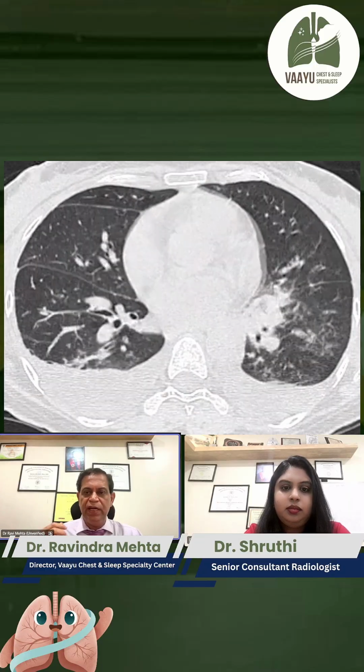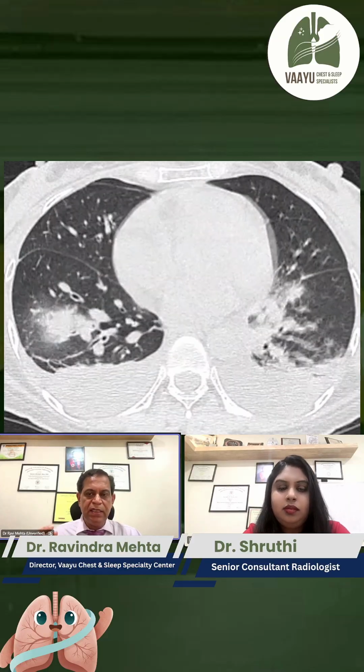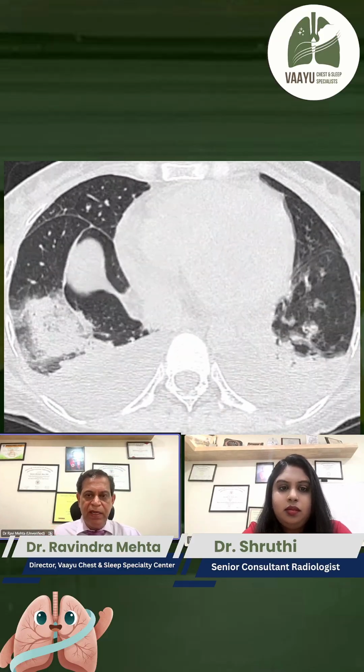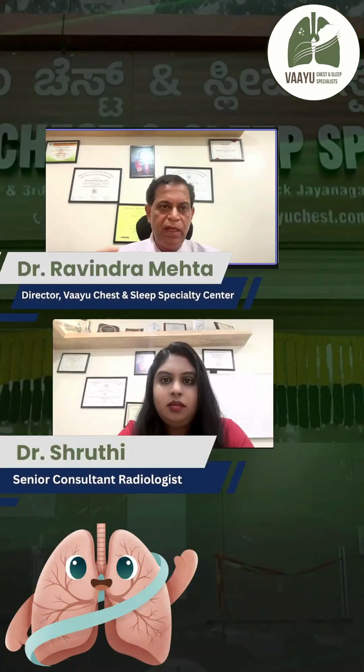But I have a question for you. As a clinician, we often are concerned that mucormycosis is angio-invasive, and we are worried that despite all the good work we do, there'll be a sudden bout of hemoptysis because of angio-invasion, and that could be causing morbidity, intensive care, or may even be fatal. How in a CT scan would you look at that, and what tips would you give the clinician?